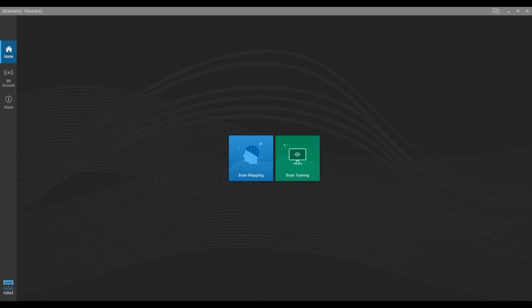So we want to be really mindful that when you use photic, you keep that cable separated from the sensors. And as long as you've got even a couple inches, you should be good. You just definitely don't want them touching one another.